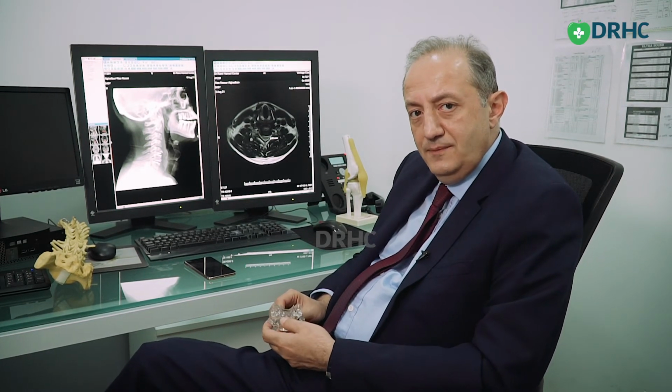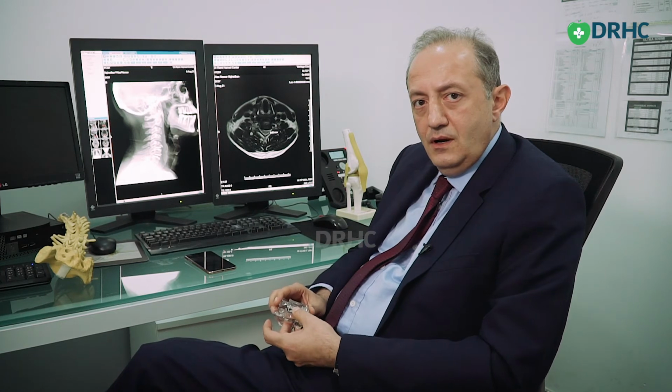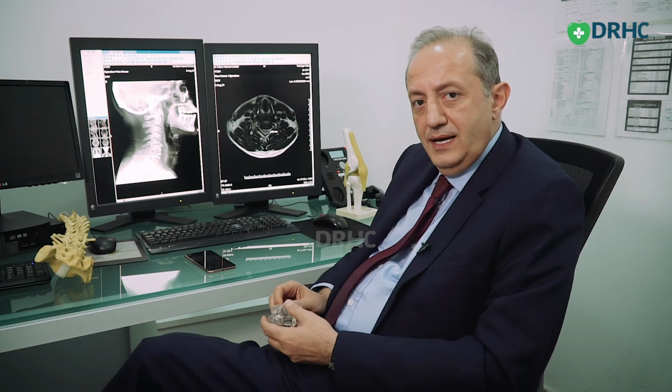This is the way I assess the need for surgery radiologically, as I explained on the MRI scan. Of course, clinical assessment, including the effect on activities of daily living, the type of pain and severity of pain, plays a higher role, but obviously the patient has already been assessed in that respect.